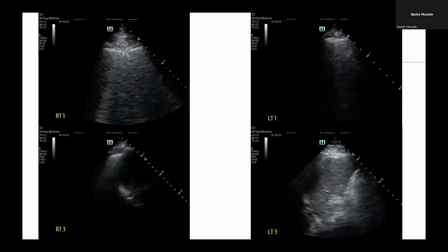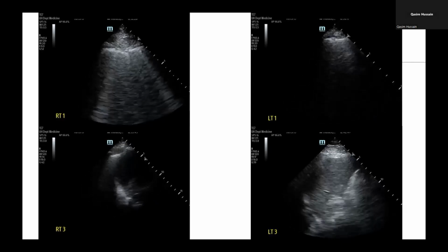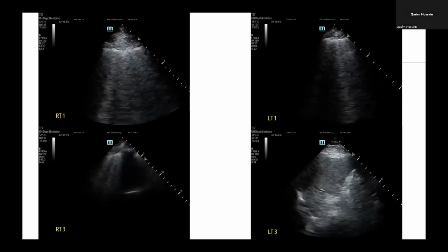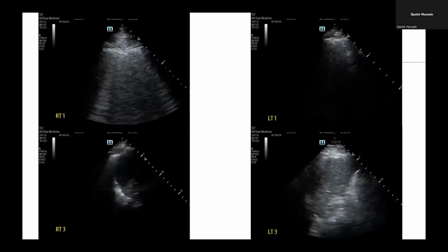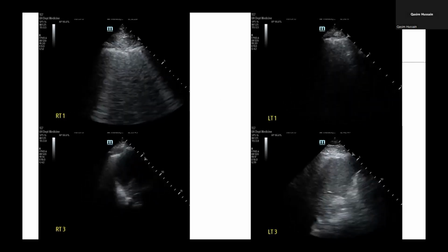So it's very non-specific. This could still be pulmonary edema. This could still be a viral pneumonia. Our differential is still pretty broad, or it could just be a byproduct of an ILD flare as well. So that's when we went ahead and scanned the heart.